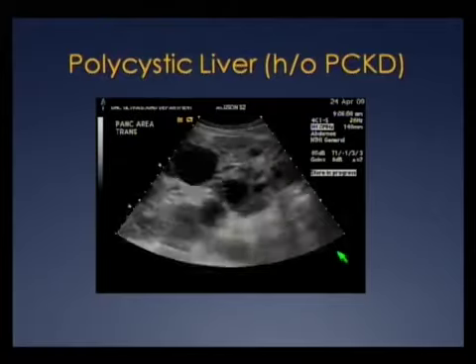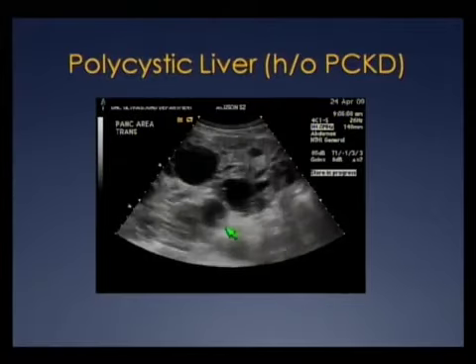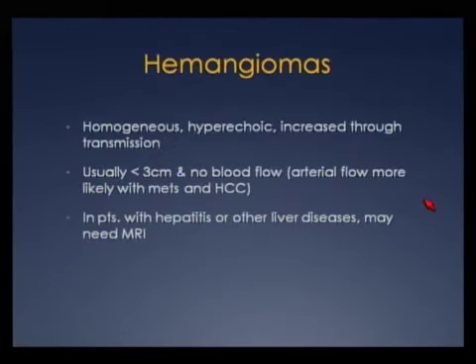And here's cine images of the same patient. Again, the anechoic lumen is very, very simple. Easy to call those cysts.